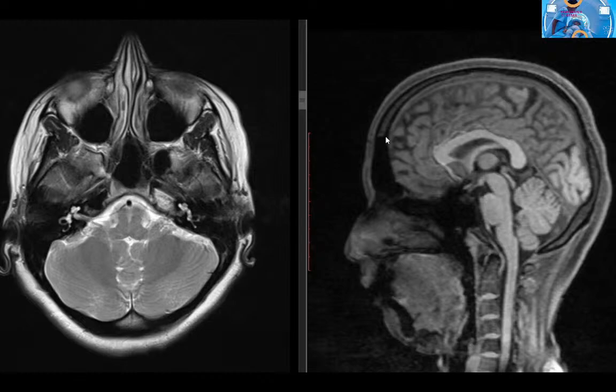The dura has two layers. The outer layer is the endosteum and the inner layer covers the brain and forms the falx and tentorium. The cranial dura has two layers which separate to enclose the dural venous sinuses. The dura appears relatively hypointense on MRI. The falx may occasionally calcify or ossify, appearing as a region of signal void due to calcification or hyperintense due to the fat within the marrow.